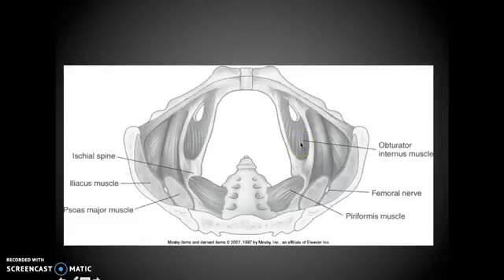Looking at the pelvis, just kind of give you a lay of the land. Here's your obturator internus. We have your piriformis muscle, so you can see how it connects, and I want you to see your psoas major. Your iliacus muscle kind of lies in the ala there.